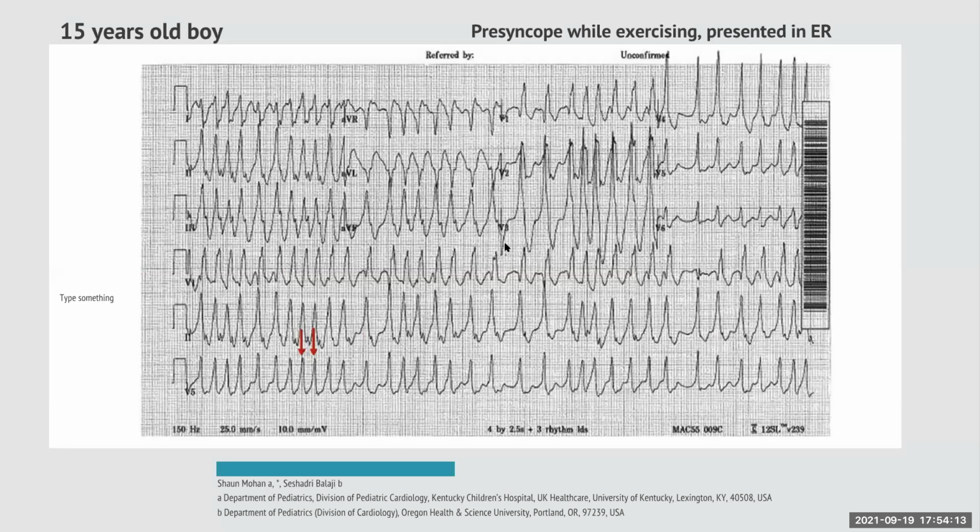The rate is very high. Is it tachycardic? Yeah, it is very high, and the interval is not regular as well, I think. Excellent, very good. So the rate is extremely fast and it's irregular. So again, the irregularity makes you think, oh, is this atrial fibrillation as we have seen before? Is this atrial flutter with a variable block? Is this multifocal atrial tachycardia?